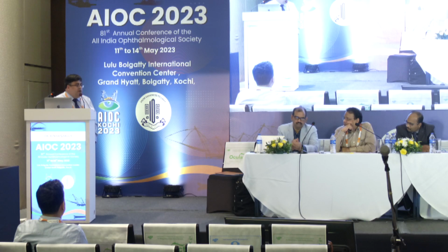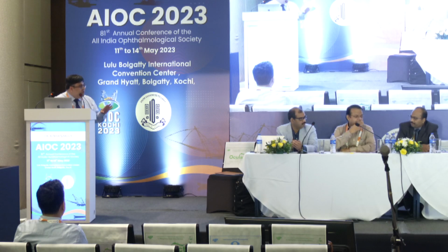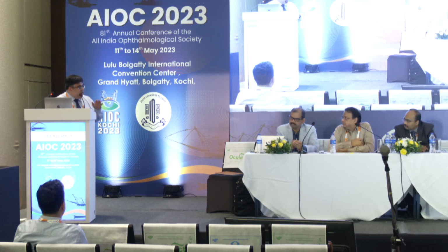Also now they have, especially the Heidelberg and the Zeiss, something called a projection removal platform, where you can actually remove the projection artifacts. So that also works. So artifacts have gone down. I won't say they're completely gone.